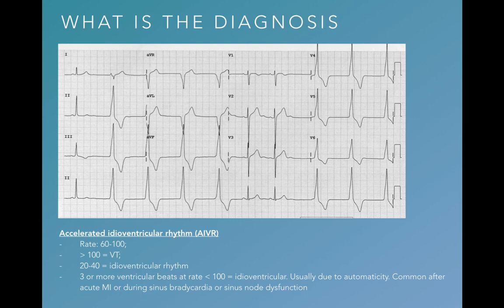And what else? So you can see a few normal heartbeats in between the idioventricular rhythm on the rhythm strip.